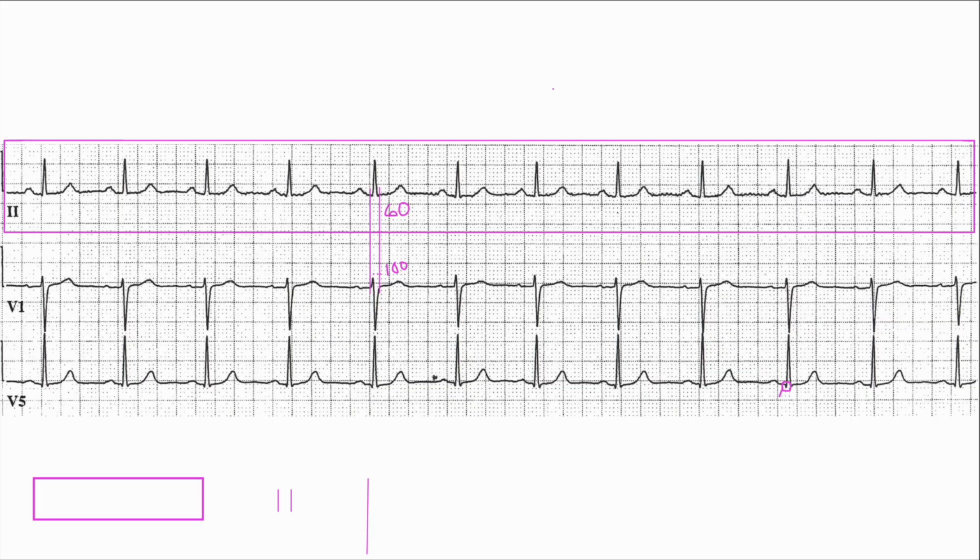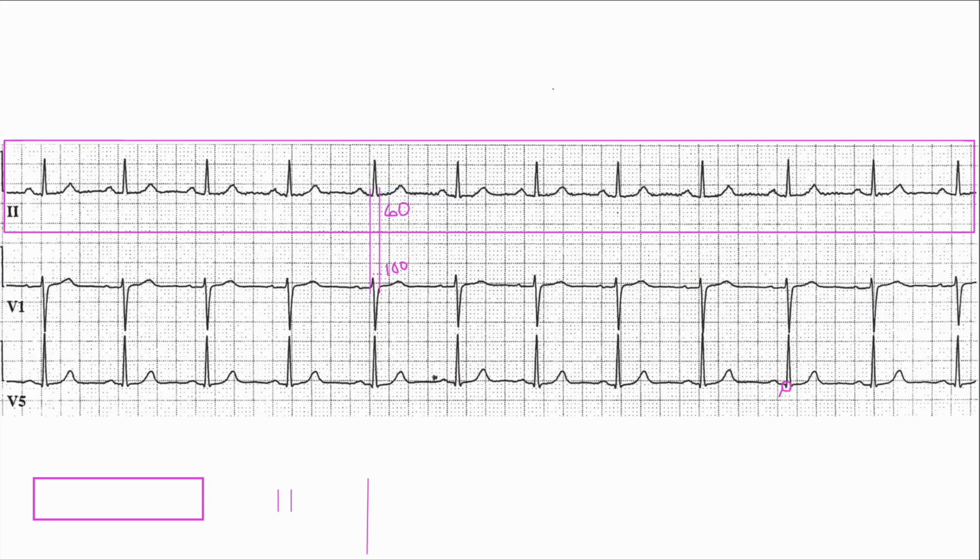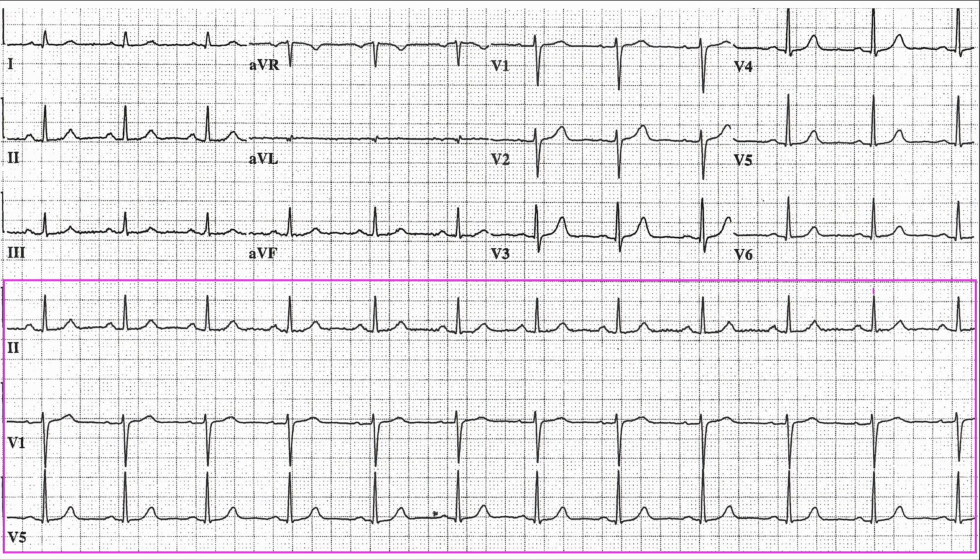Okay, now going back, right, overview analysis. Now, this is a deep dive, so I'm kind of going into the nitty gritty. A lot of you that are familiar with this stuff, feel free to fast forward through it, right? Nothing else jumping out at me, so let's keep moving. And now we are getting to the 12 lead, right?